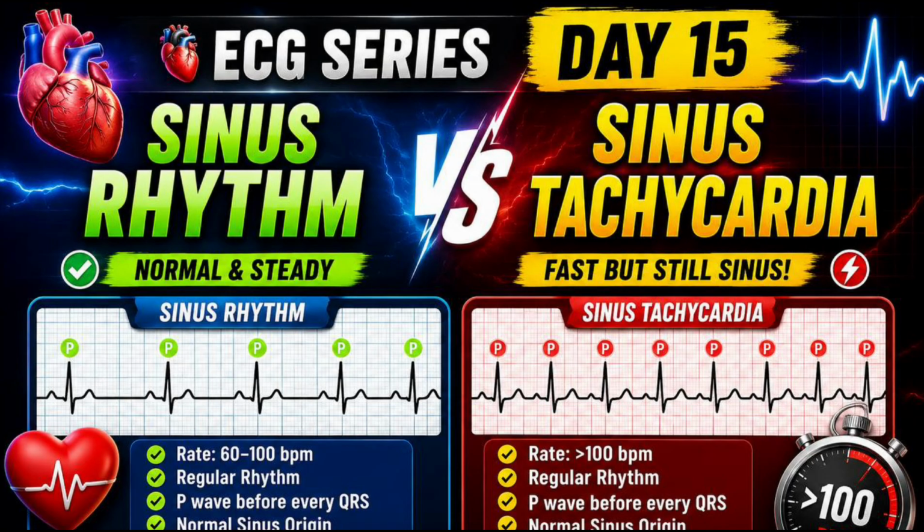So far, we have learned the ECG waves, intervals, cardiac axis, and heart rate calculations. So, today we will learn one of the most important rhythm topics: normal sinus rhythm versus sinus tachycardia. This is one of the first things every doctor checks while interpreting an ECG. By the end of this lecture, you will be able to differentiate a normal sinus rhythm from sinus tachycardia in less than 1 minute. So, without wasting time, let's begin.